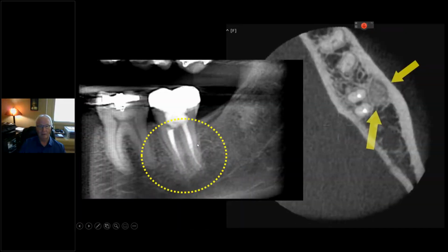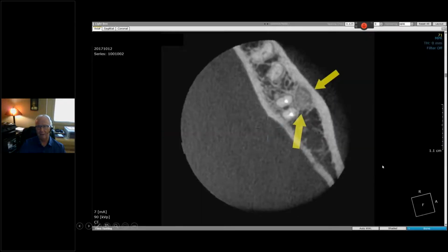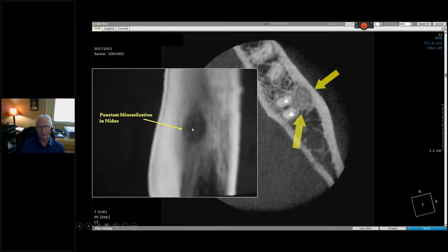And I don't know whether or not the root canal was done just because that's where the patient pointed, and the actual lesion was not related to pulp death at all, but happened to be this rare lesion called an osteoid osteoma. So if you look at this, it's an older plain image off the internet, showing that mineralization shows up much nicer on the cone beam imaging.